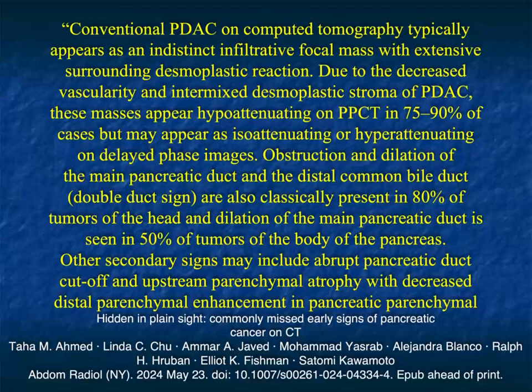If you see it sometimes, with higher resolution scans, you can see the duct, but the duct over 3 millimeters, you have to worry. And if you see a duct and it stops, you especially have to worry. We see many cases that the initial scan showed a mildly dilated duct with cutoff, and the radiologist wasn't concerned. When you see cutoff, you have to be concerned. If cutoff is early, you may not see pancreatic atrophy distally, but if the cutoff has been there for a while or it's a very sharp cutoff, there may be distal glandular atrophy. So look at all of those features.